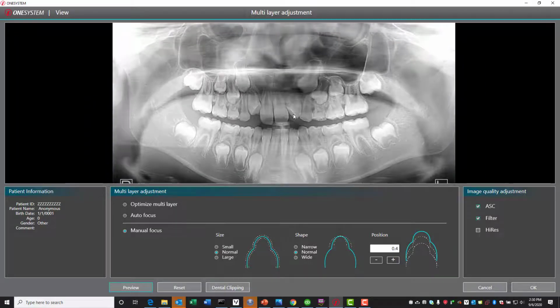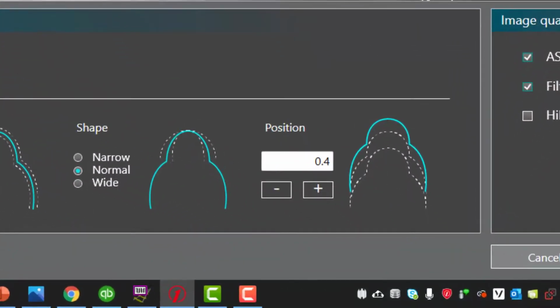Now, what's also nice is that you can save as many of these panos to your imaging software that you like. After each adjustment, just click OK and that version will be saved. We can do further adjustment if we'd like to further optimize. Just follow the same process.